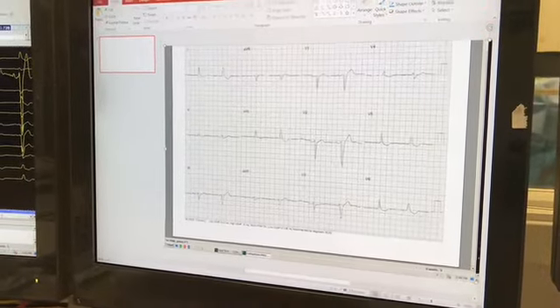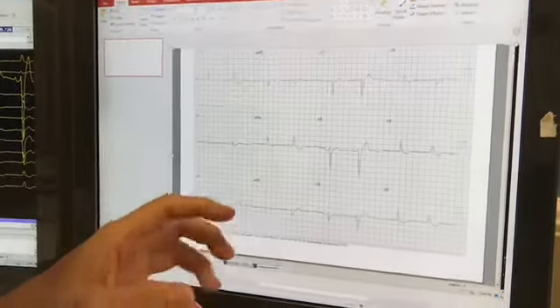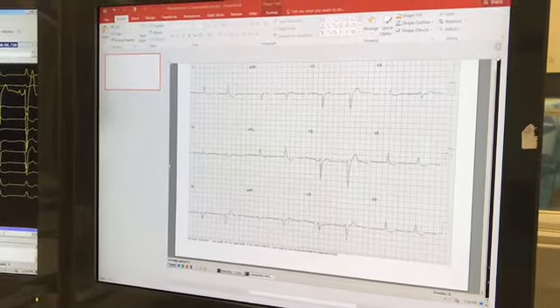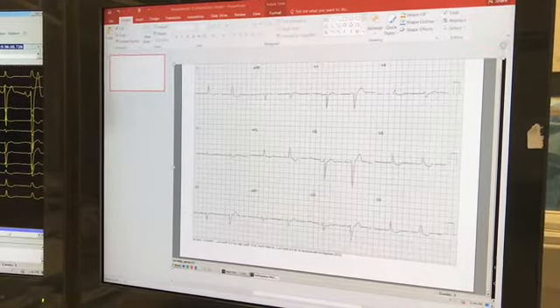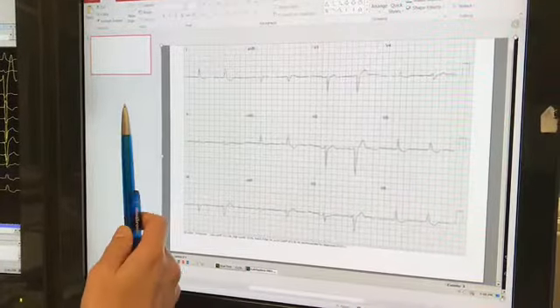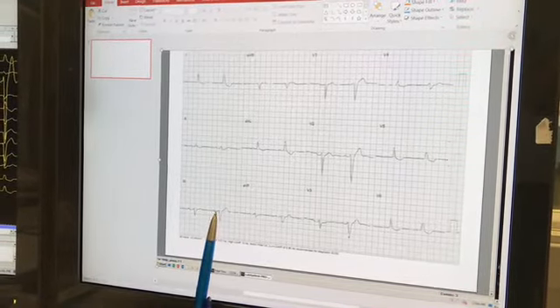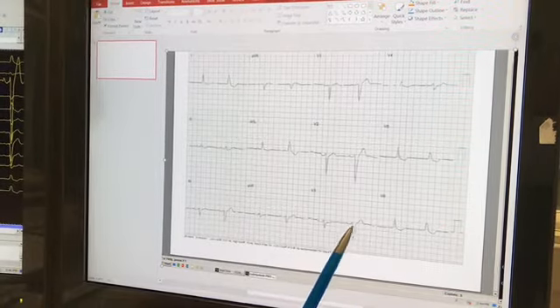Okay, good. So, hello. Today we're going to talk about a scenario post-TAVI. This is a patient in her 70s. She just had a TAVI 4 days ago. And on the ward, we were noticing a prolongation in PR interval. But here, I would like to point out this phenomenon where we have a QRS alternans. And I want to point out this narrowish QRS, a longer QRS: narrow, broader, narrow, broader, narrow, broader.